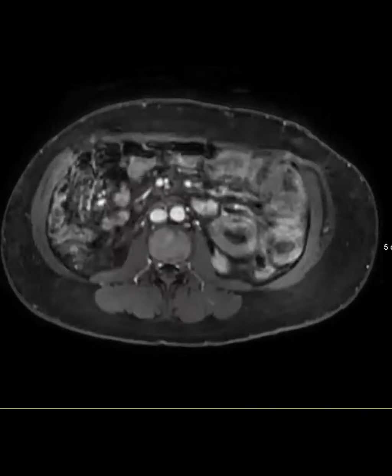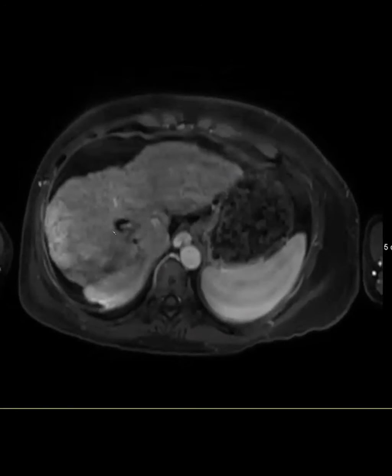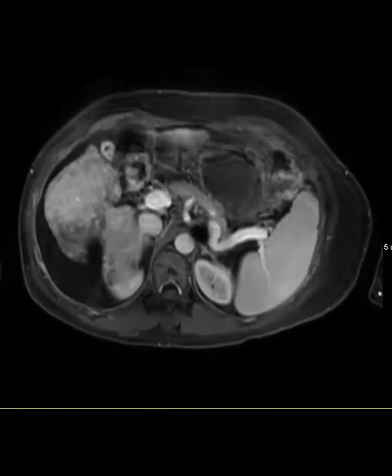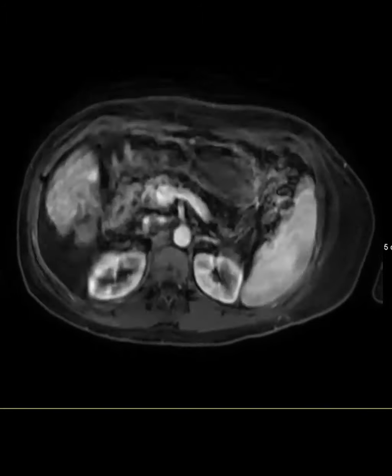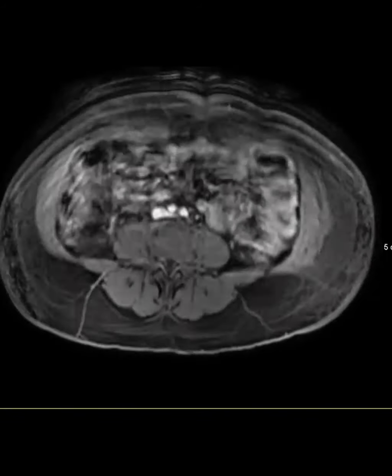The patient's TIPS was actually thrombosed in the main portion; this portion was open. It was a very strange looking area, with heterogeneously decreased enhancement. There was really no arterial phase hyperenhancement in this region, right? It's hypoenhancing here. There's actually retraction of the capsule, which makes you think maybe there's some sort of fibrosis.